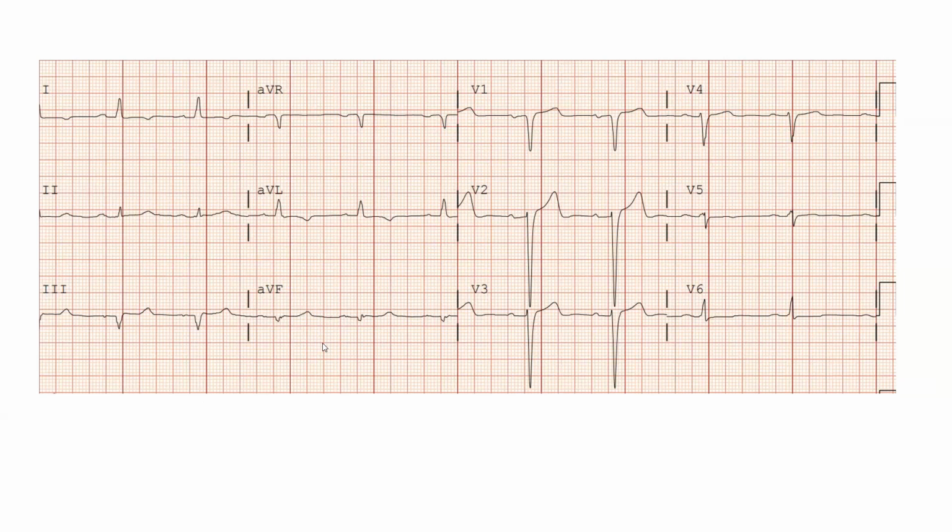So seeing this tells me it may very well be an anterior infarct. Now I think the R waves in lead 1 and AVL don't fulfill the 4 millimeter criterion, but they are fairly small, especially in AVL. This is suggestive of an anterior MI. And indeed, this patient does have apical akinesis on his echo. Now, this is far more likely to be a non-transmural infarct and a viable infarct compared to a full-blown Q wave anterior MI, full-blown QS waves between V1 to V4, V5.